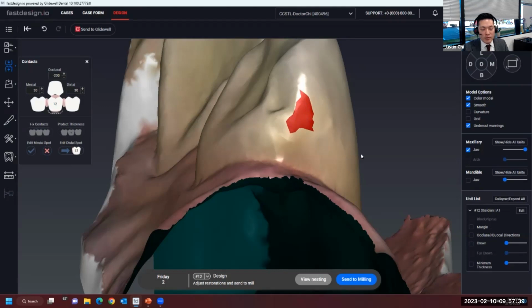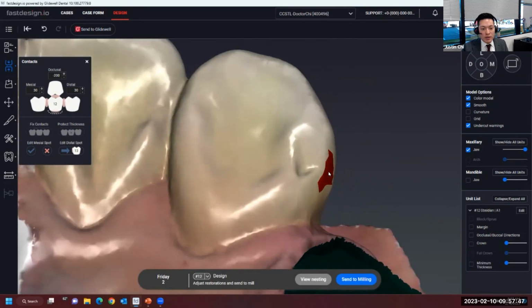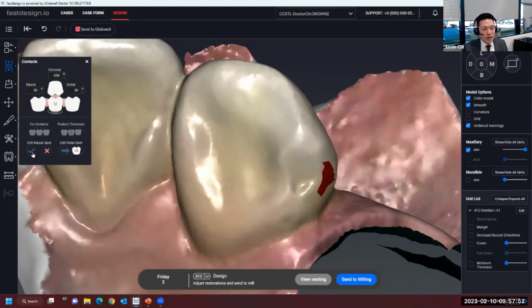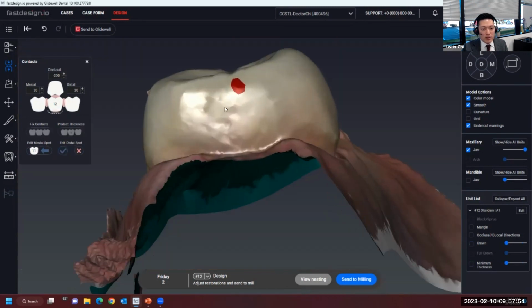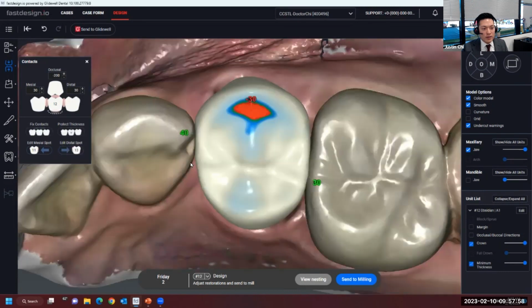So it is also dependent on that premolar shape as well, where it's not quite vertical, like if we were up against the lateral on the mesial side. But this is the area of the canine that is facing our premolar. And let's look at the distal contact. Let's make this a little broader. Okay, let's go ahead and accept that.